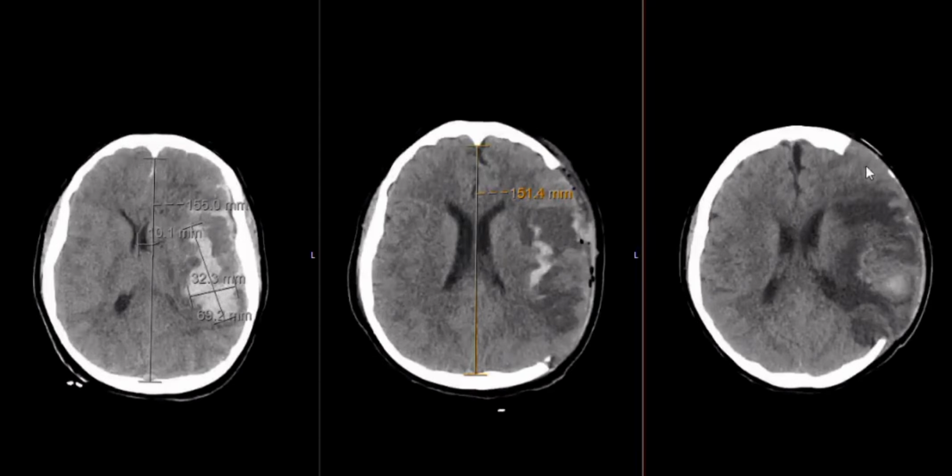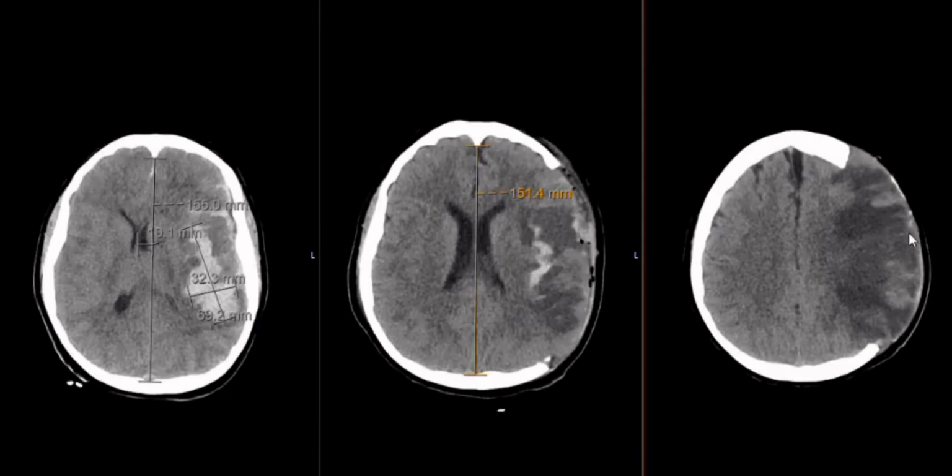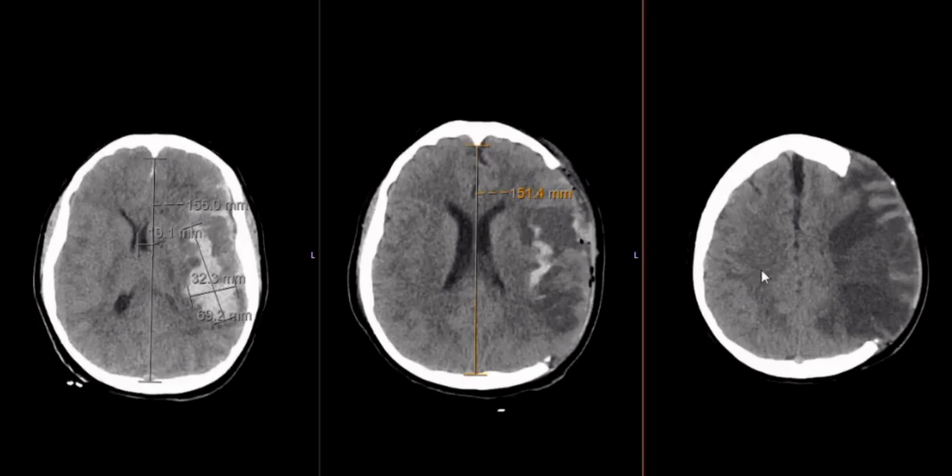Brain bulging out in that direction. So the edema in here has worsened across time because the actual bleed and pressure has probably infarcted a significant middle cerebral artery territory. Yeah. So what we have here is grey-white differentiation on this side, and then loss of grey-white differentiation on that side to some degree.